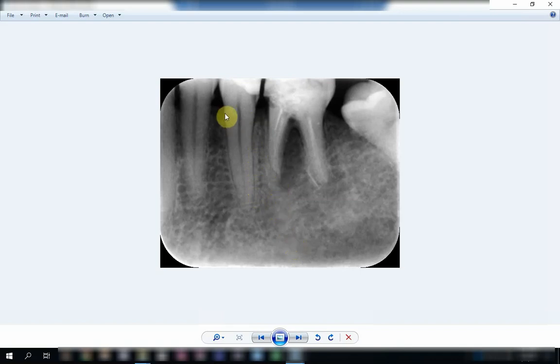As we agreed earlier, a healthy PDL should have an equal thickness from the alveolar crest down to the apex on either side of the tooth. Now, the important thing here is that the PDL is continuous, and if the image of the mental foramen overlays the PDL, and then we are in a dilemma of whether this is a radicular radiolucency or not, our reference is the PDL. Let us know how.